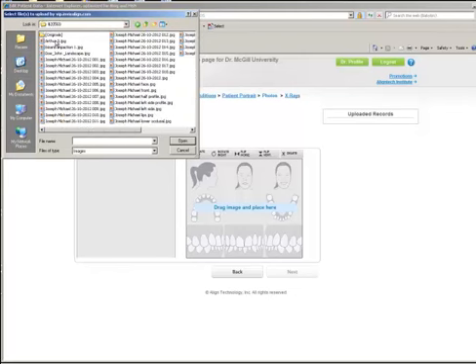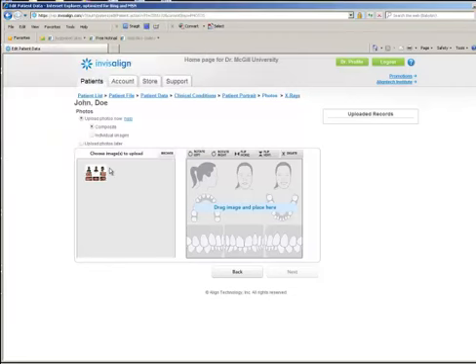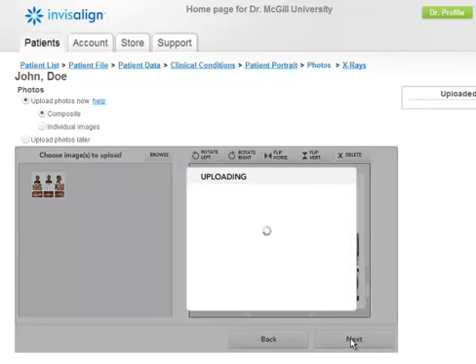As you can see, this patient has a template right here that has already been created on the Kodak template, landscape. So this patient now is dragged in here, and you can click next again.